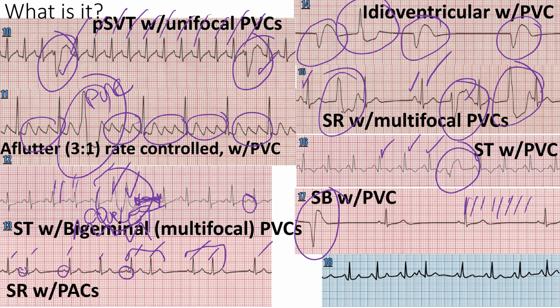And right down here, that looks pretty early. Got a space in here for some reason. So that's abnormal. This P wave is like all over the place. That looks normal, but then we have this early PAC. It's narrow, it has a P wave, it occurs earlier than expected, premature if you will, and that's considered a PAC, sinus rhythm with a PAC.